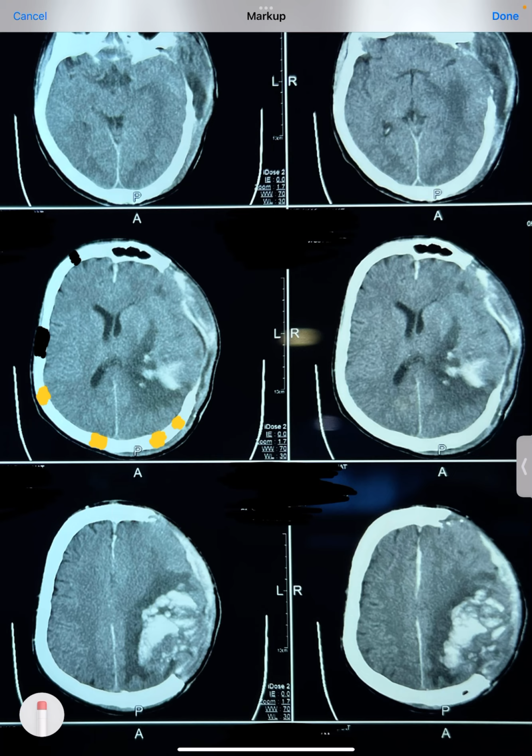So, sudden onset occurrence of this much dense white structure has to be blood. So this is very typical of a bleed. This particular patient had a history of road traffic accident, and he had presented in altered sensorium. So this dense white structure is all blood.